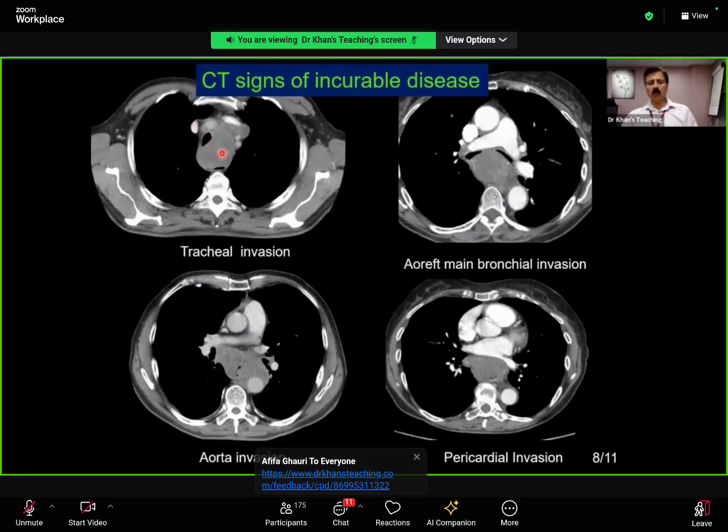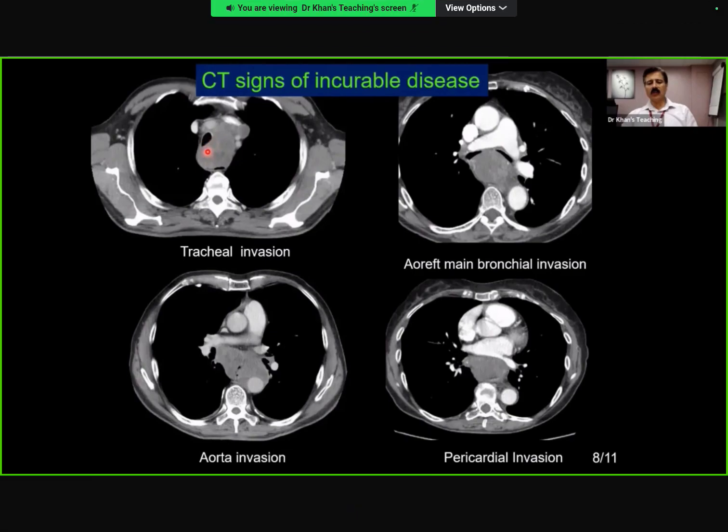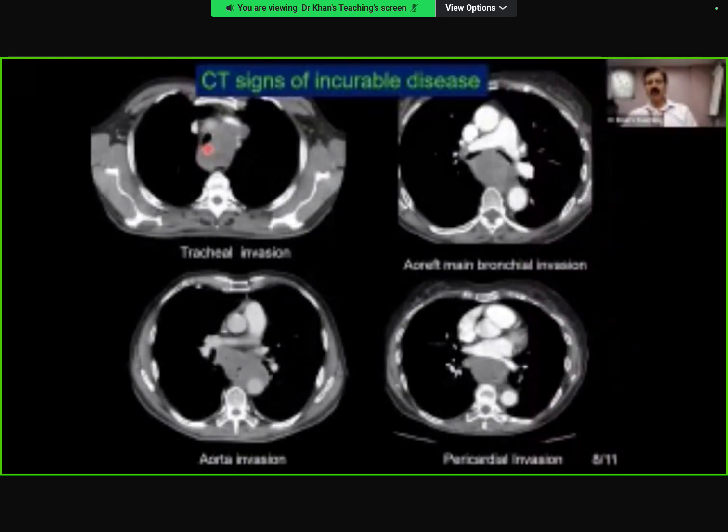The main thing you are looking for, in a very large tumor, is signs of tracheal invasion. So if there is posterior indentation or anterior displacement of trachea, you can raise that on a CT criteria, I'm worried. Please remember that our sensitivity and specificity is not as good as EUS, but these are the CT criteria, right?